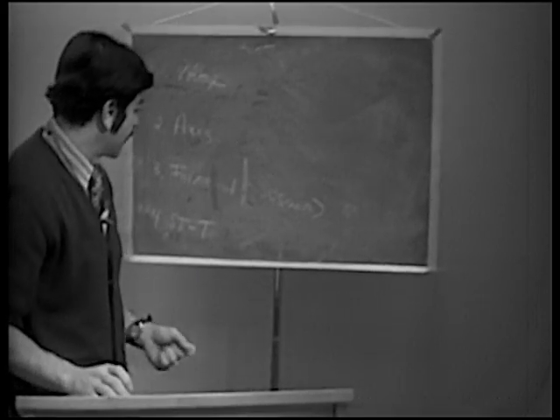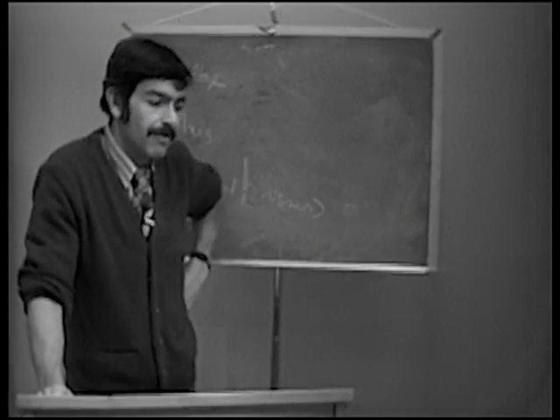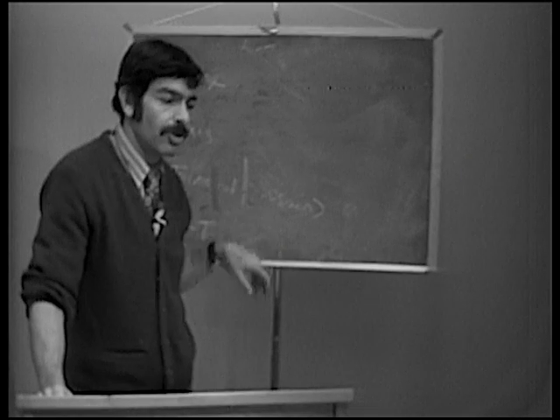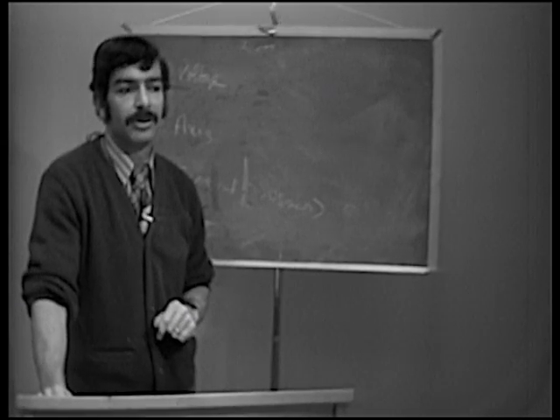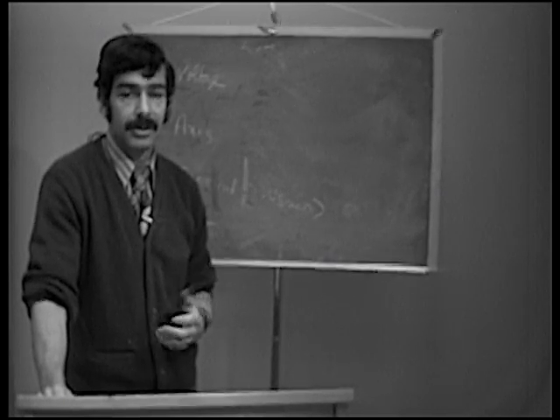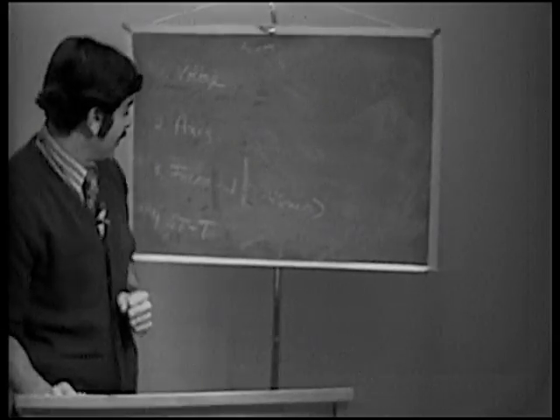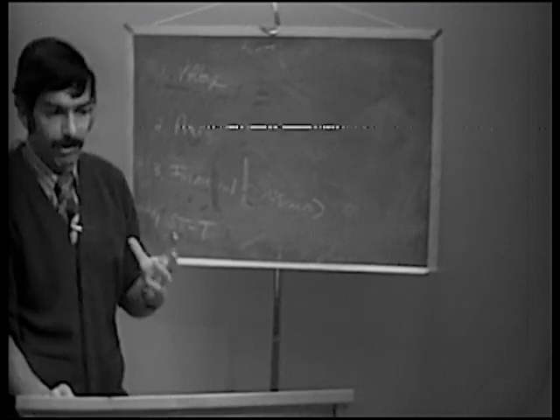Okay, now let's talk about these ST-T wave changes. These are a sign of severity in left ventricular hypertrophy. If you see LVH in association with ST-T wave changes, this patient probably has pretty severe left ventricular hypertrophy, and it's getting to the myocardium. It's doing nasty things to the heart muscle. You're getting relative ischemia.